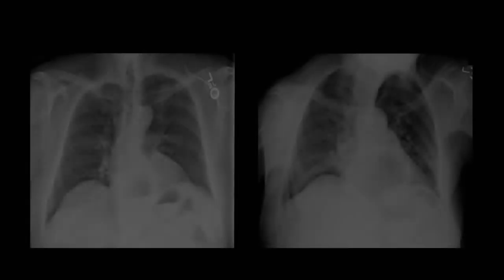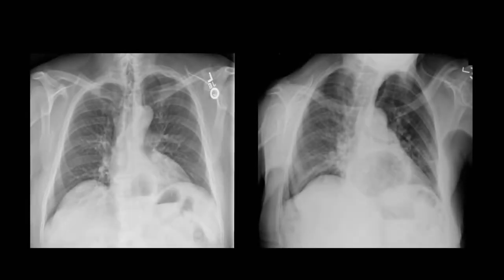What do you notice in these X-rays? In each, there appears to be a pocket of gas in the mediastinum within the cardiac silhouette. This is how a hiatal hernia looks on X-ray, which occurs when a portion of the stomach herniates upwards through the diaphragm into the thorax. While patients can develop significant GERD-like symptoms from this, it also can be surprisingly asymptomatic.